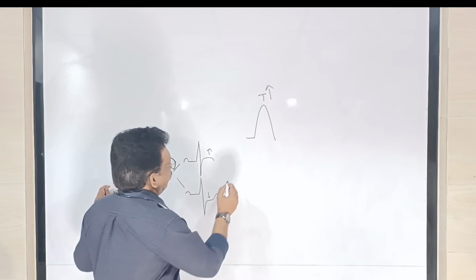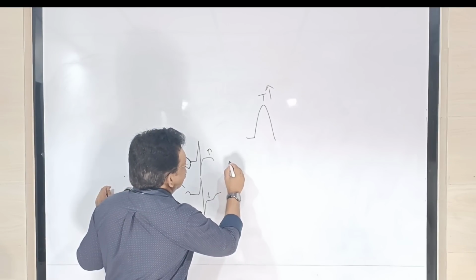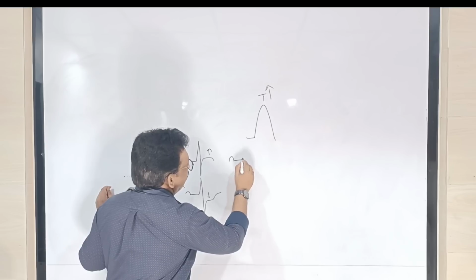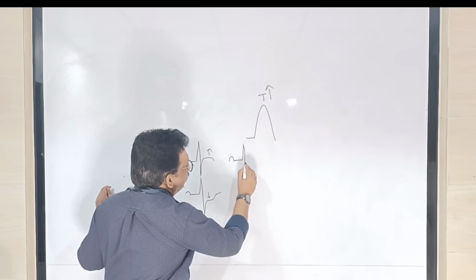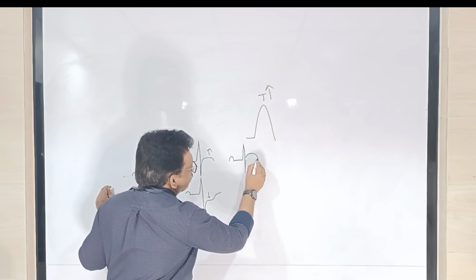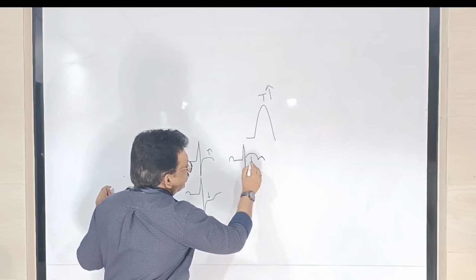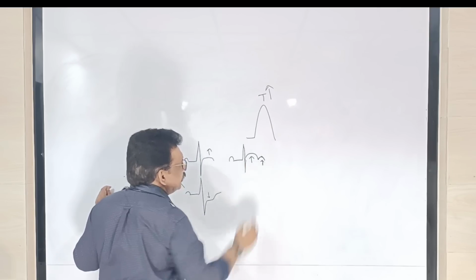Now we'll see the ST segment, what happens. So P wave is there, PR interval is there, that is the isoelectric line. QRS complex is there. Then you can see there is ST elevation, then tall T waves. So the T wave is also tall, the ST segment is elevated.